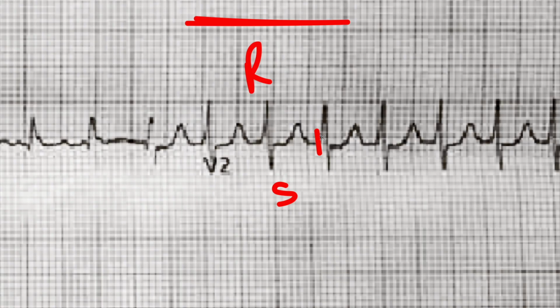So what I'm measuring from is the onset of the QRS to wherever, let's say the P wave was right here. This would be 80 milliseconds. So if your onset of the R wave, right? So onset of your R wave to the onset of your supposed P wave is less than 70 milliseconds.